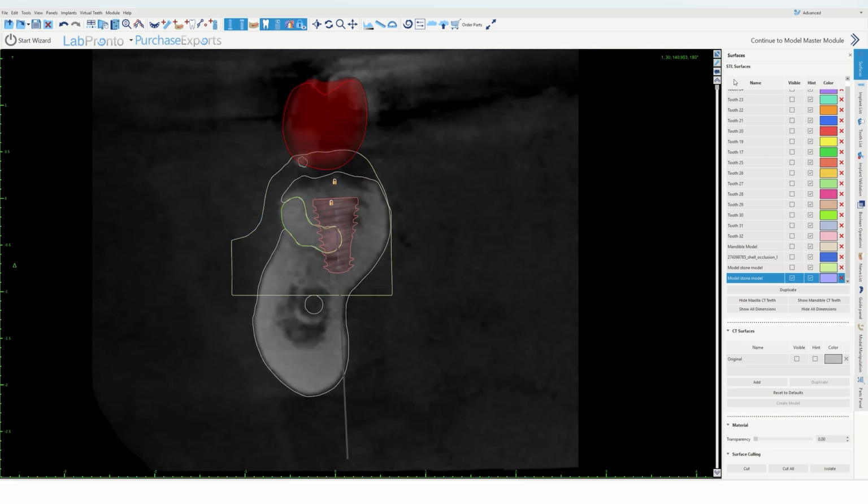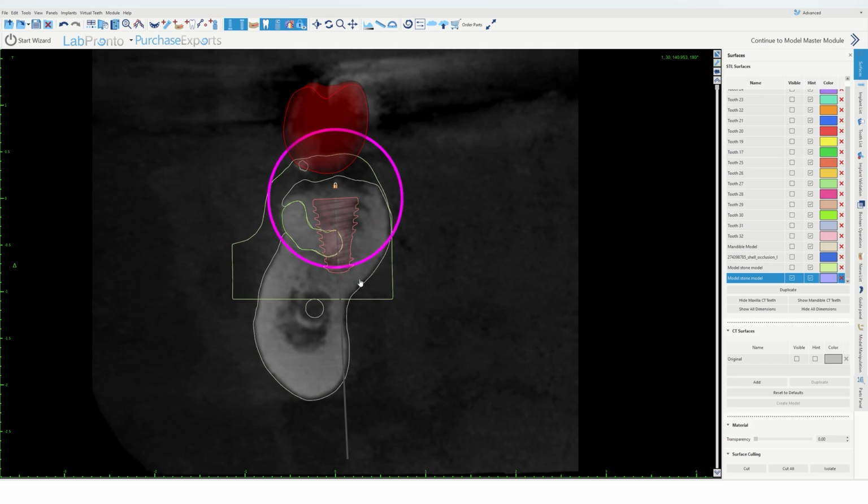Start at the top, see if we like this. I don't want to get too close to here. What if I over drilled by accident? Or God forbid, the drill went too long. We want to have a little bit of a buffer here in this area, here to here. All right.